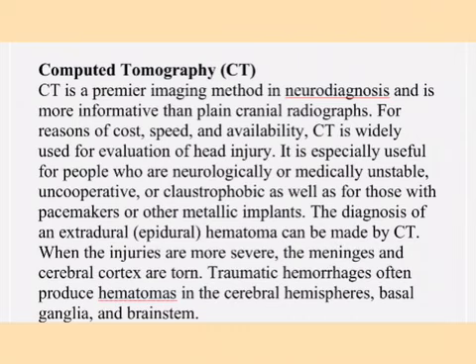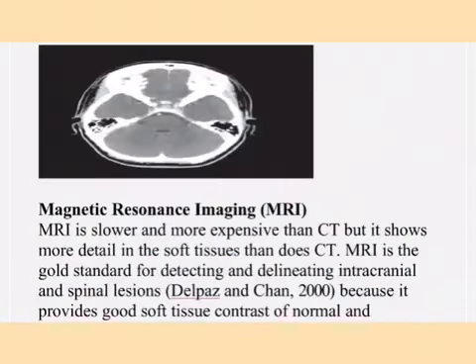When the injuries are severe, the meninges and cerebral cortex could be torn, and you can see that diagnosis with CT. Traumatic hemorrhages often produce hematomas in the cerebral hemispheres, basal ganglia, and brainstem. So with CT, you can appreciate all that.